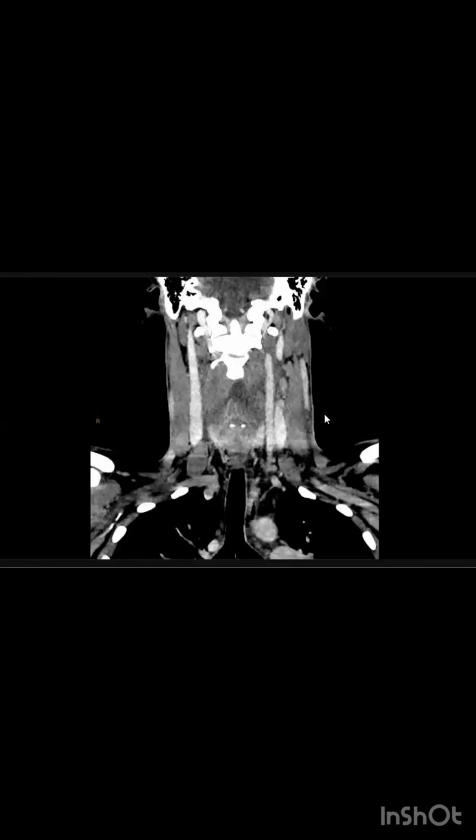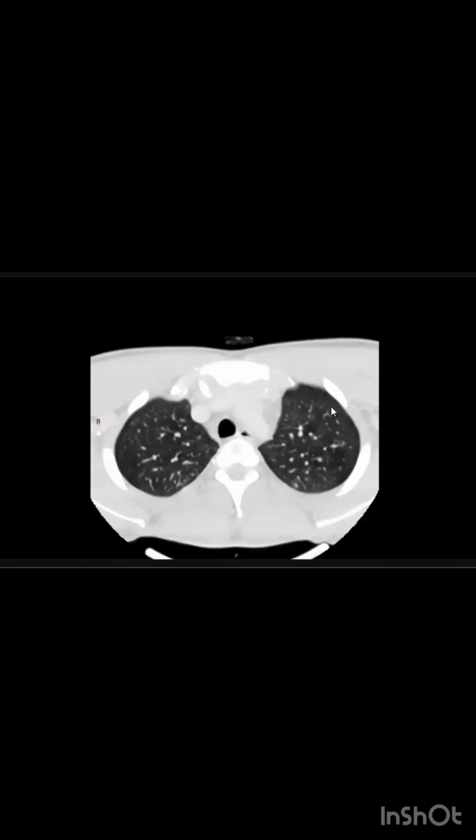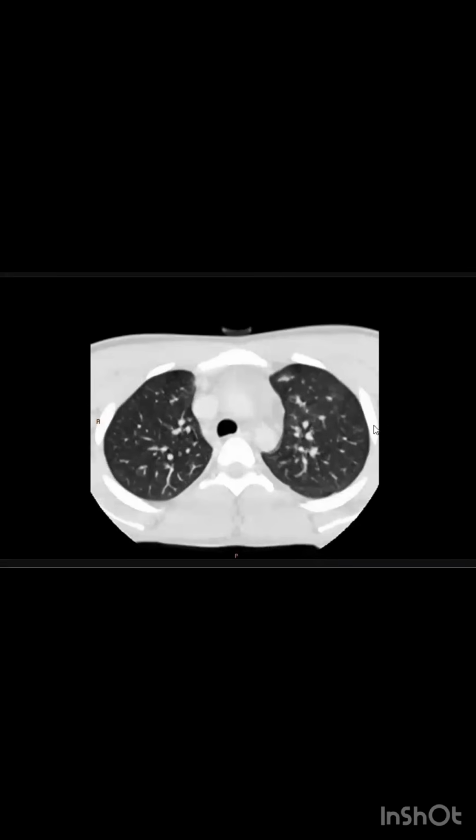Okay. What complication will you search for in a case like Lemierre syndrome? I would search for mediastinitis, involvement of any carotid vessel thrombus, and any septic emboli to the brain. Okay, can you scroll through this image, please? Yeah, so I'm presented with HRCT contrast enhanced CT images of the same patient. I would like to give a scroll before describing the findings.